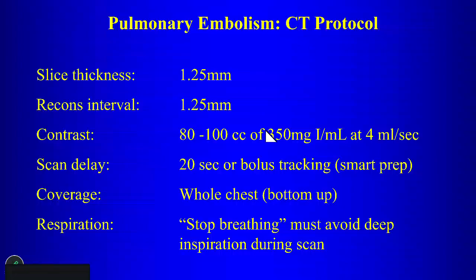You'll notice that when you're looking at a PE scan, many times, at least on the old GE scanner with the protocols that are set up there, you can recognize as soon as you open the study that it was a study for PE, because it starts at the bottom, and as you scroll through, it goes to the top, right? It goes from the bottom to the top. I don't think that's true now with the Alpha scanner. The protocol there, I think, goes from the top down.